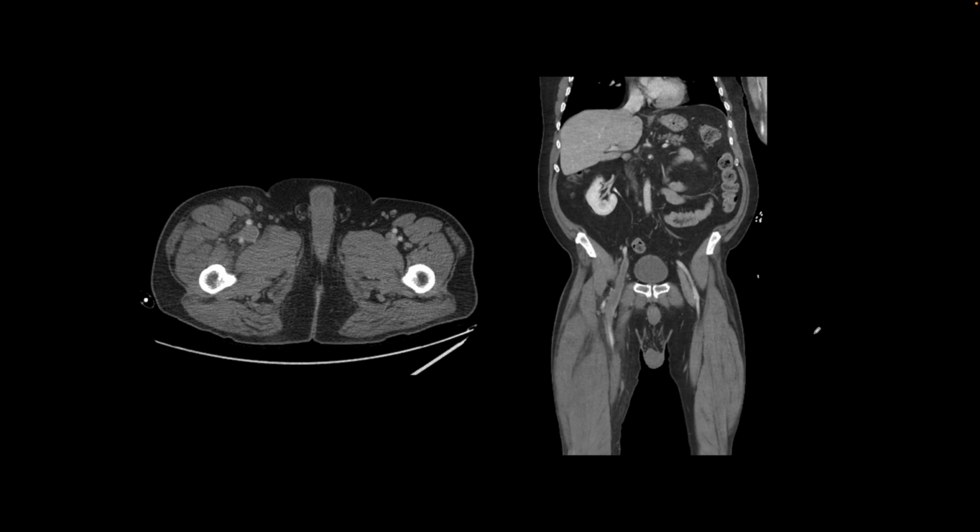This is our next patient where the finding is subtle, almost like an eye test. So look at the vein here. Compare the vessels on the left side to the right side. The right-sided vein is expanded and there's a filling defect, also seen right here, expanded vein with filling defects. So DVT that was detected on a CT abdomen and pelvis.